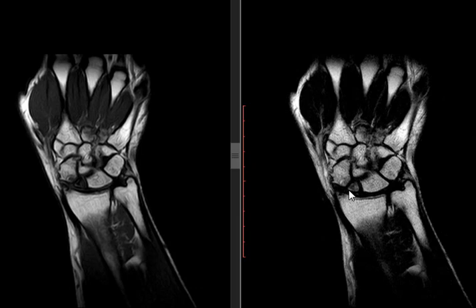They are sitting in place. A simple minute, let's agree, now this is part of the scaphoid. Okay. Why does it look like this, split in one? It's just one bone. Previous fracture, for example, or trauma, resulting in avascular necrosis. Where is the fracture? This is the fracture line at the waist of the scaphoid, making it two parts, two avascular bones. Where is the avascular necrosis, in this part or in this part? Which part is avascularized?